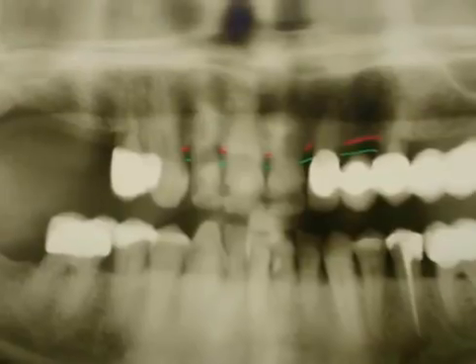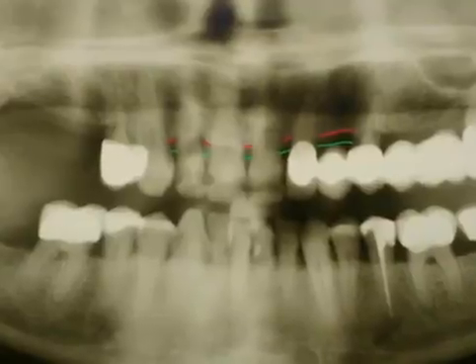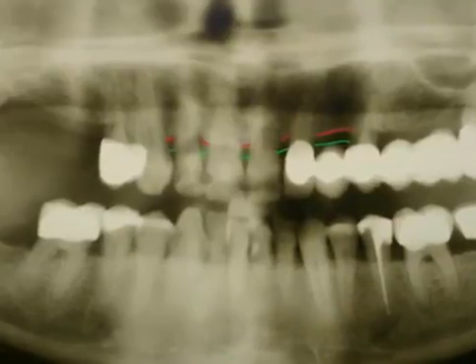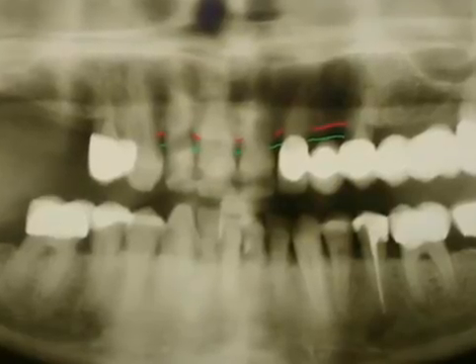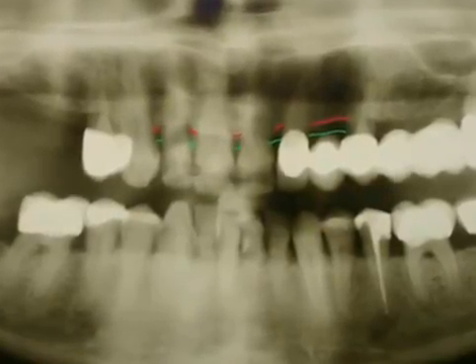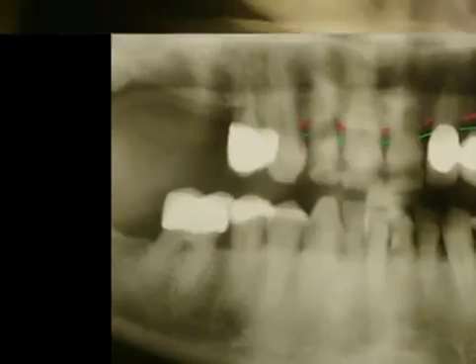Usually the alveolar bone runs 2 mm below the enamel cement line, the green line. Because the periodontitis was left untreated, bone has been receding for years. It is easy to see the horizontal direction of bone recession, the red line.